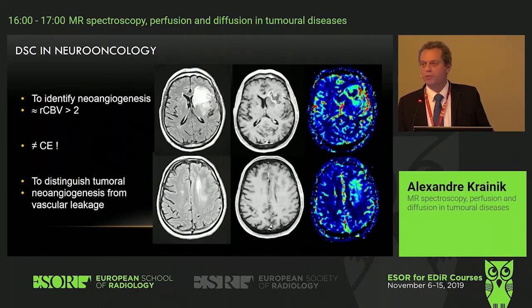It's a very important point because in glioma, for instance, it's what is stated in the pathology analysis from a low grade to a high grade. I mean, the level of angiogenesis is very important to determine because the quantity of abnormal vessels will also be related to the severity of the tumor, to the grade of the tumor. Then here you can see a CBV map, and on the border of the tumor, you have a contrast enhancement, and you also have an increase of cerebral blood volume.